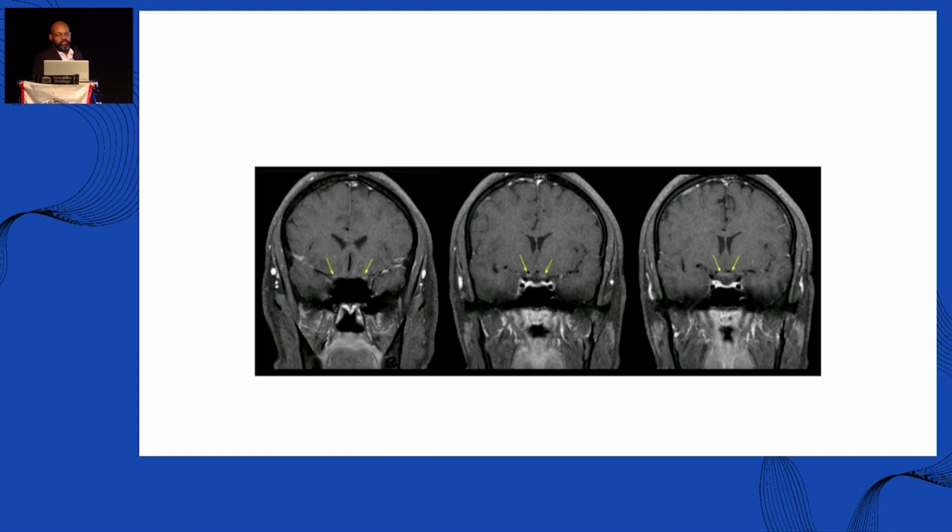I'll go through this very quickly. There's mild enhancement, and there's a hyperintensity involving the chiasm and the posterior part of the optic nerve, right? What would this kind of picture, what would be your diagnosis? The sequential loss of vision, the optic nerves, last case, so I'll stop after that. Lot more, but yeah.